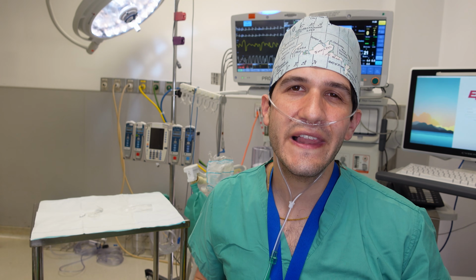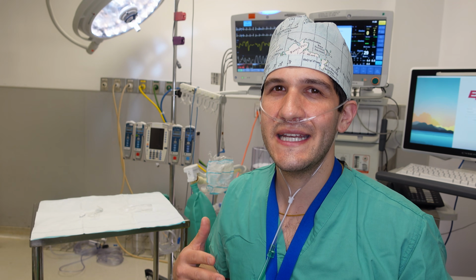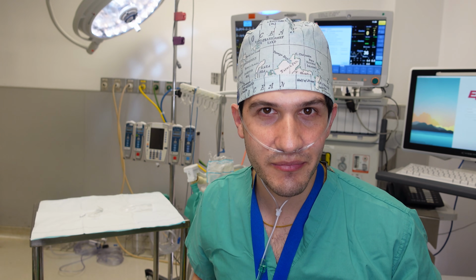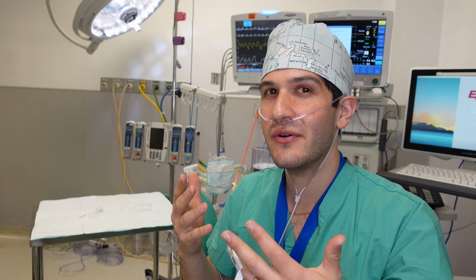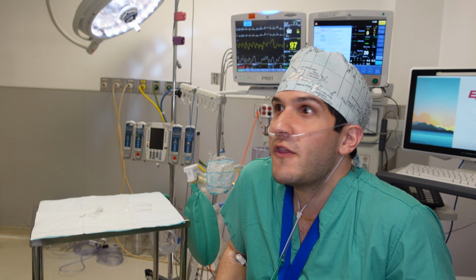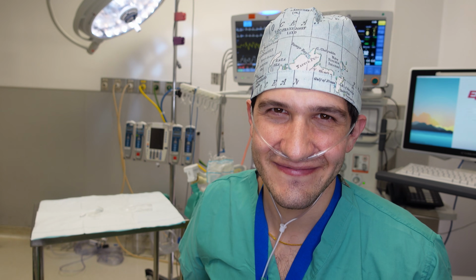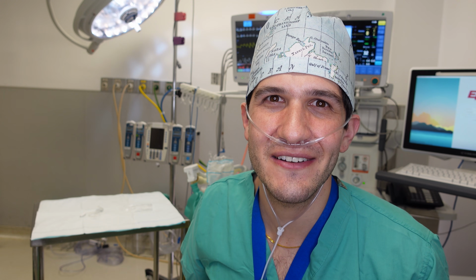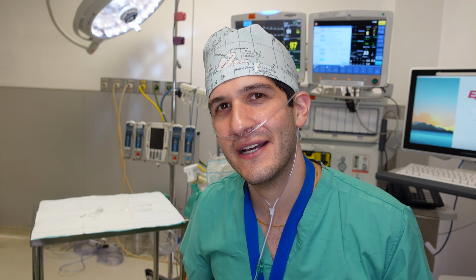So this is one of those classic setups for the joke on the med student where the resident knows that the pulse oximeter and the blood pressure cuff are on the same side, and as soon as the blood pressure cuff starts going off and the patient appears to be desaturating, the resident will go, "Oh my God, is everything okay?" And the med student will be like, "Oh my God, the patient's desaturating." And the resident will be like, "Gotcha. Same side pulse ox and blood pressure cuff." I wouldn't actually do that to a medical student, but it is worth pointing out.